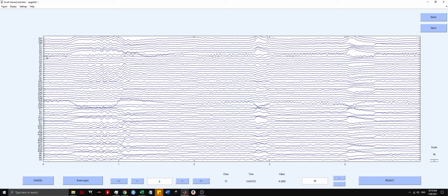And if your electrode is noisy due to imperfect contact, this can increase the noise of other electrodes if you're using the common average reference. So that's why you would want to interpolate. Filtering can help with noise like it kind of did here, but it's not an effective way of dealing with bad channels. And so what you can do is you can interpolate the channel.